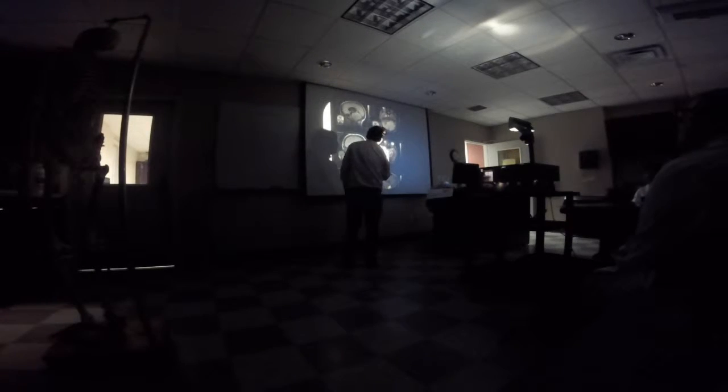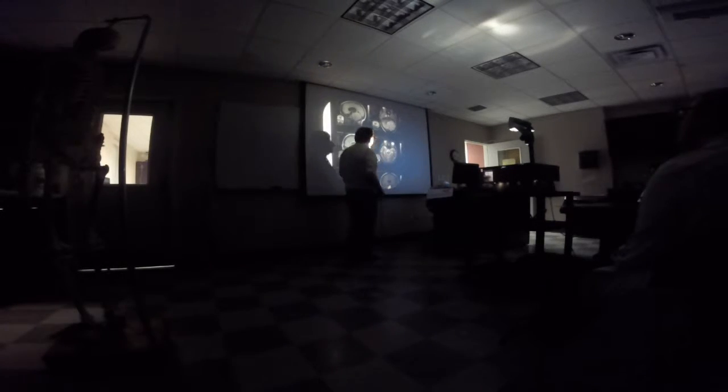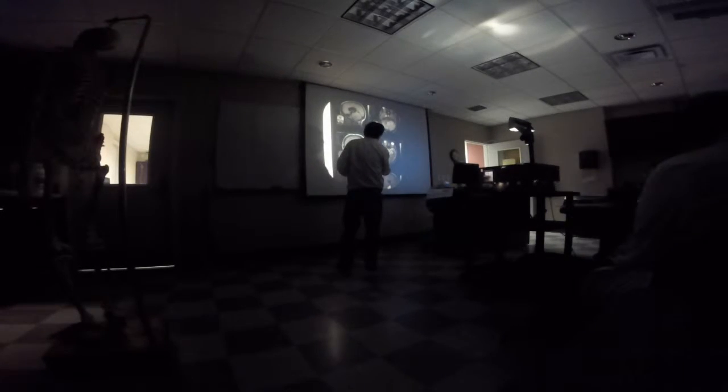What is this right here? What is this structure here? Corpus callosum. No. This is the anterior-most aspect of the cerebellum. It's peeking through. Does that make sense? Notice the architecture is different. It has folia.